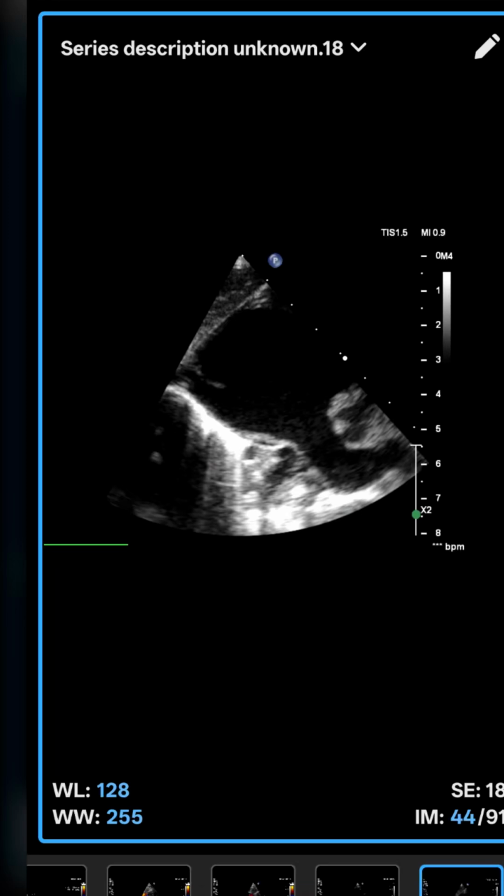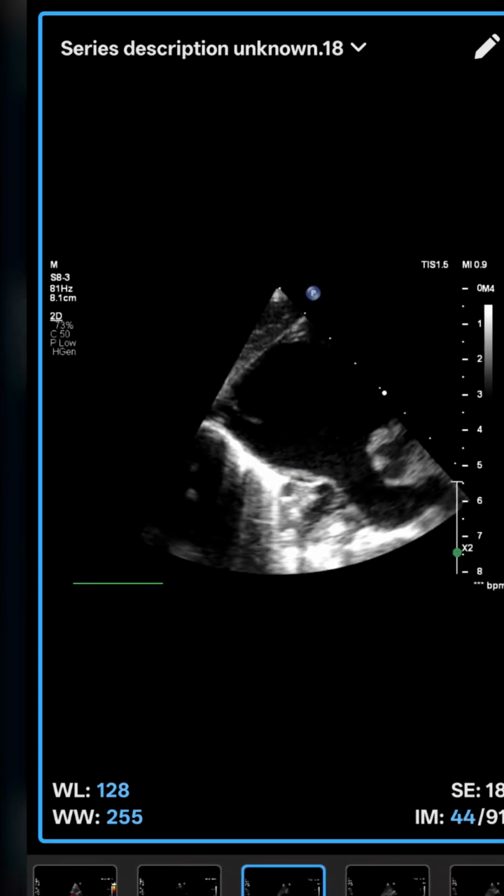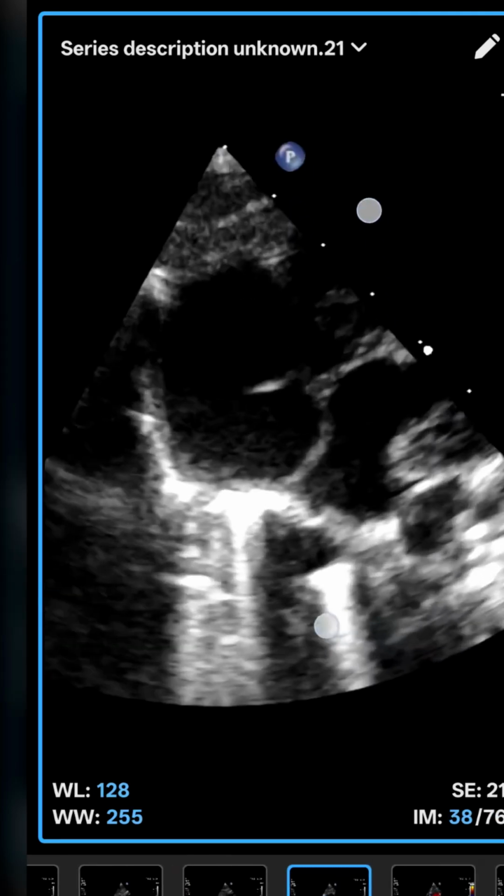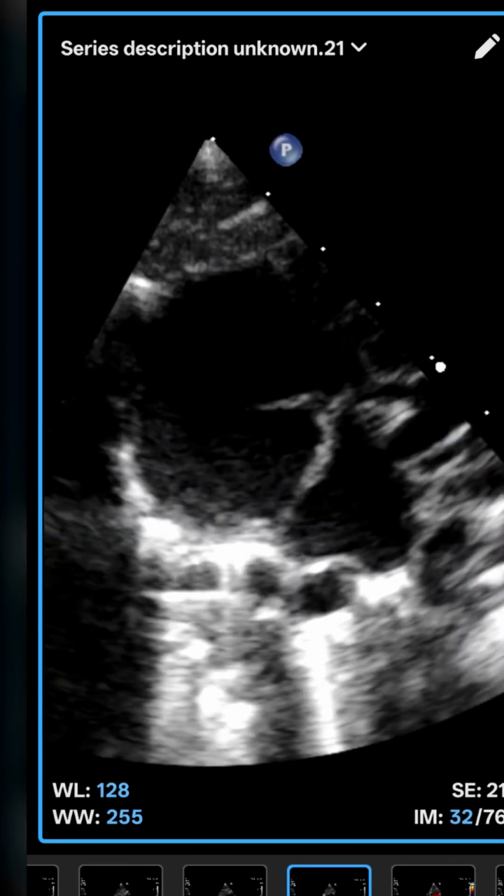So whenever you get right sided chamber enlargement, left ventricle chamber D-shaped, left atrium relatively less in size as it is not receiving any pulmonary vein, and another chamber simply located superior to left atrium, that indicates that this is a case of anomalous pulmonary venous connection. But this mixed variety of total anomalous pulmonary venous connection is very rare. It's a very rare finding.